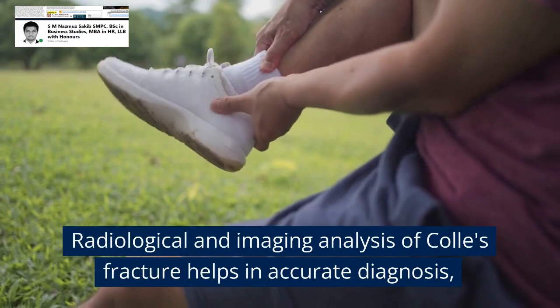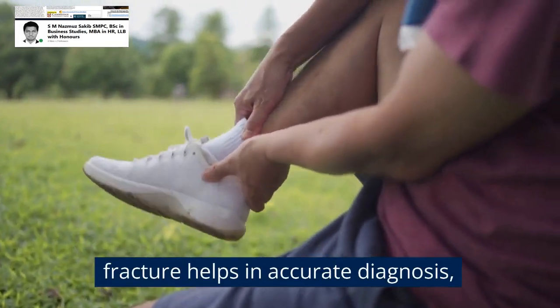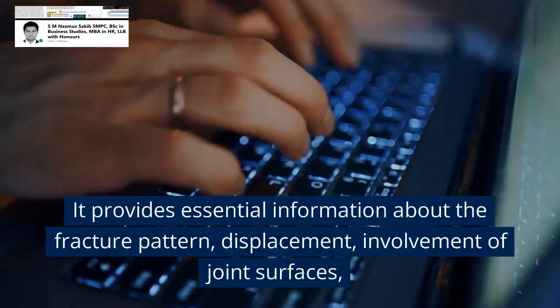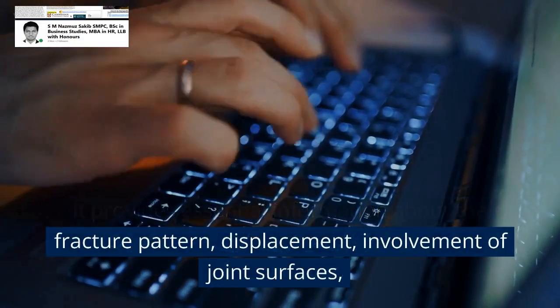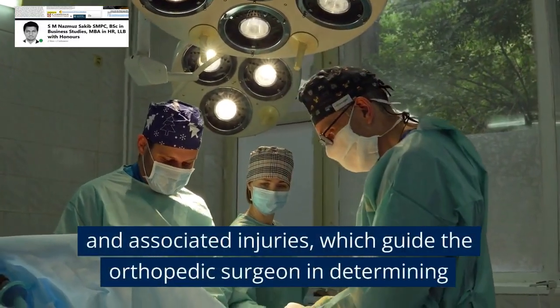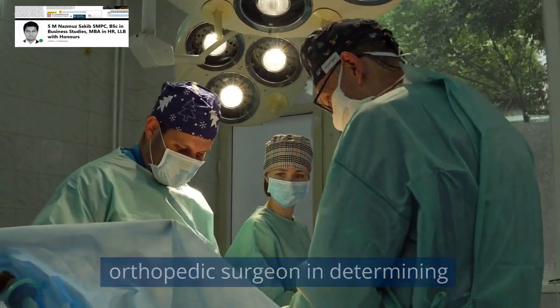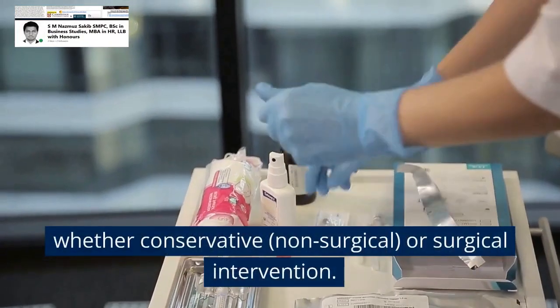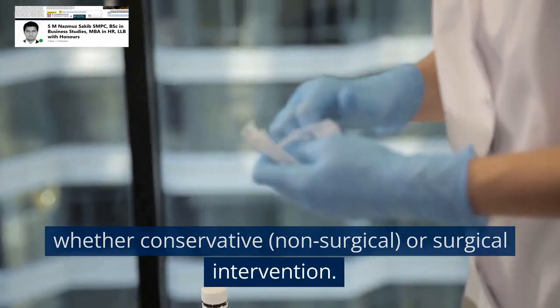Radiological and imaging analysis of Colle's fracture helps in accurate diagnosis, classification, and treatment planning. It provides essential information about the fracture pattern, displacement, involvement of joint surfaces, and associated injuries, which guide the orthopedic surgeon in determining the appropriate management strategy, whether conservative, non-surgical, or surgical intervention.